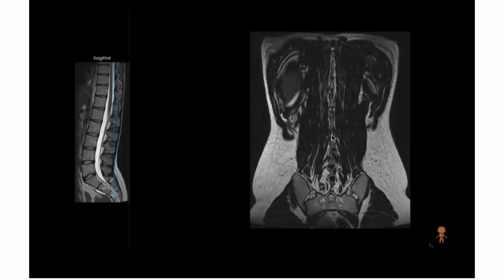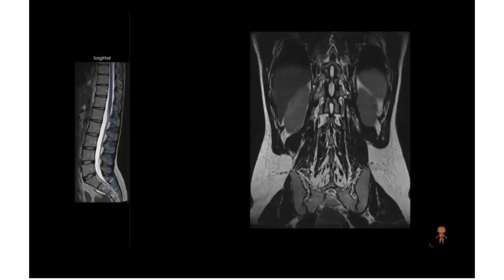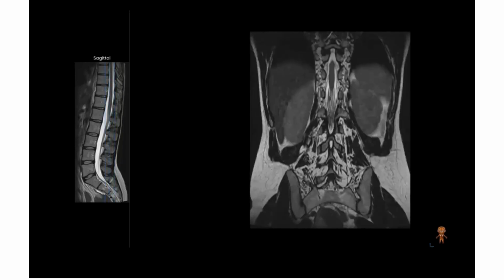Okay. And now in the lower part, we start seeing the spinous process. Now you can see the spinous process over here, in the center. So we are going from posterior to anterior, and we can start seeing all the structures over here. Now, if you look at this area, the lower spine, the lumbar spine, we are somewhere at the laminar level. You can see the facet joints over here.